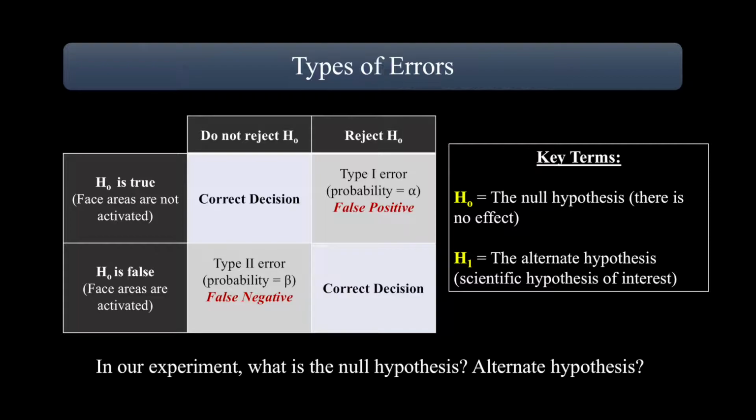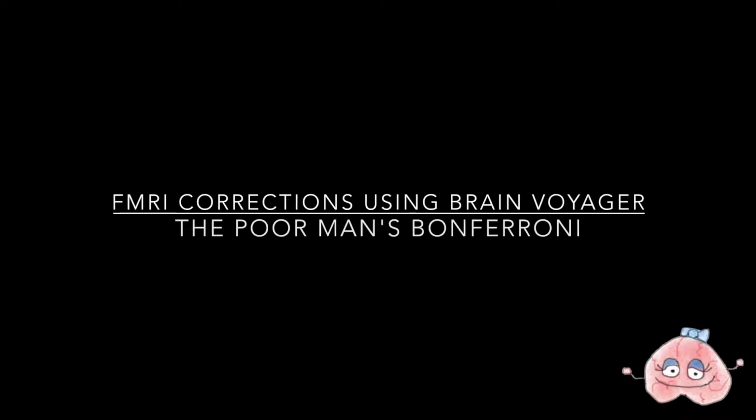Corrections can be used as a solution to the multiple testing problem. The multiple testing problem is present when our analysis requires a large number of statistical tests. The more tests we run, the more conservative our threshold criteria must be. This is a particularly pertinent issue in neuroimaging. In functional neuroimaging, one might find that voxels may be activated outside the areas of the brain. We do not want to include these voxels in our analyses.